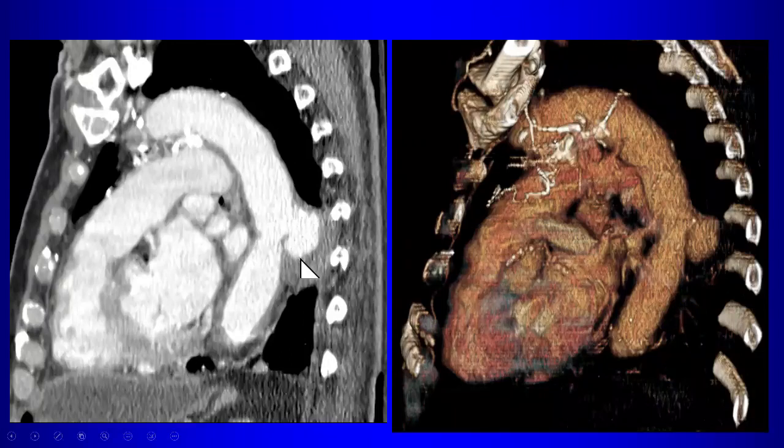So with the penetrating aortic ulcer, what happens is you have ulceration of a plaque that extends into the aortic wall, so that the contrast actually extends outside the aortic wall, just like an ulceration in the GI tract, and then you get intramural hematoma around it. To differentiate this from ulcer-like projection: with an ulcer-like projection, you first get intramural hematoma, and then the ulcer-like projection occurs later. The intramural hematoma there is often a pretty extensive abnormality. Whereas with a penetrating aortic ulcer, the intramural hematoma is centered around the ulcer.